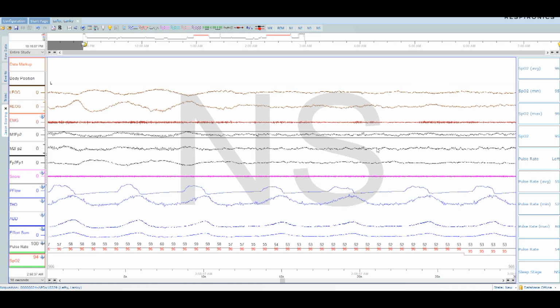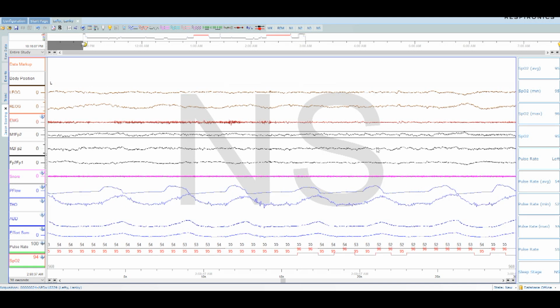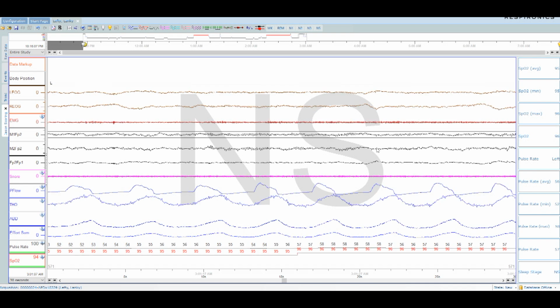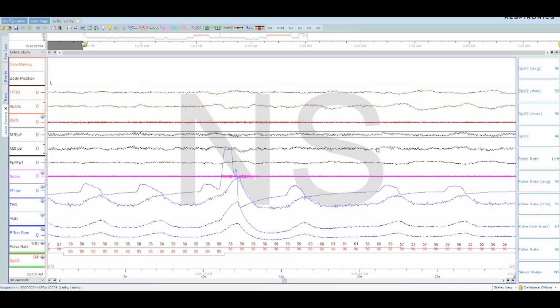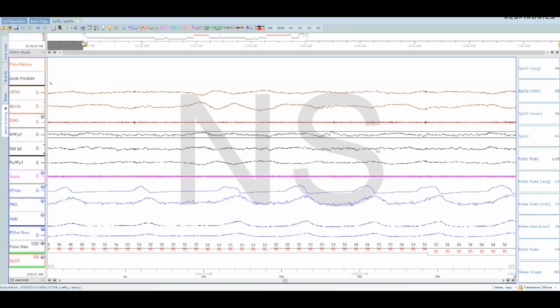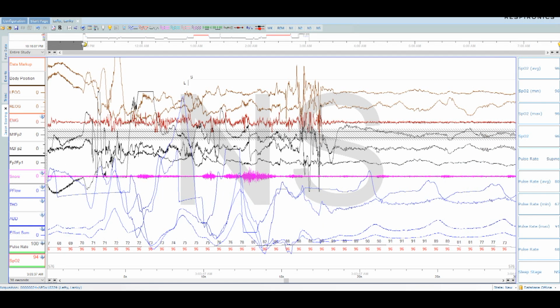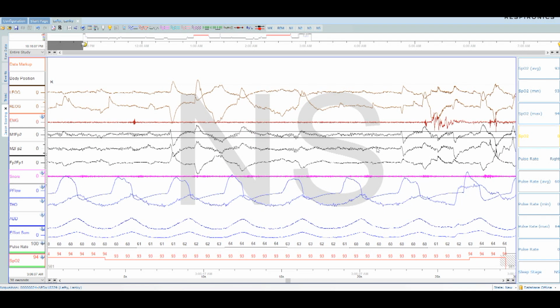So this is all awake. That's asleep. Why am I going? So now I'm awake. Now I'm asleep. Now I'm awake. Oh my gosh. Hopefully you can pick up on that. See the alpha through there. So I'm awake. Wake.